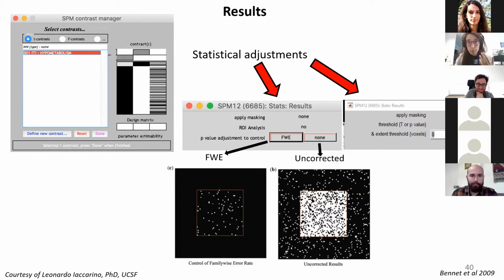What we see really works for this specific purpose, which is a clinical purpose, is to set a threshold to uncorrected 0.05 and that's it. We can also set a spatial threshold. You can tell SPM, show me only the clusters that survive a p-value of 0.01 or whatever, and that have an extent of 100 voxels. So only if we have 100 contiguous voxels that are all below the statistical threshold, show it to me.